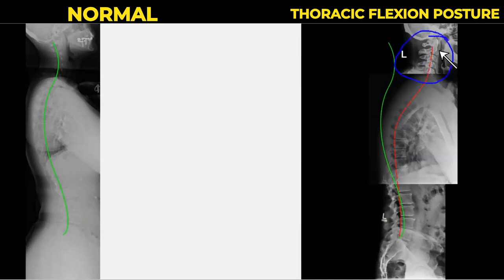If you just focus on exercising the neck and bringing that back with chin tucks, you're not really addressing the thoracic spine at all. So we need a full spine corrective approach. Also, what I want to show is, it's hard to see here, but there's degenerative changes happening here, there's degenerative changes happening here, and there's degenerative changes happening here.